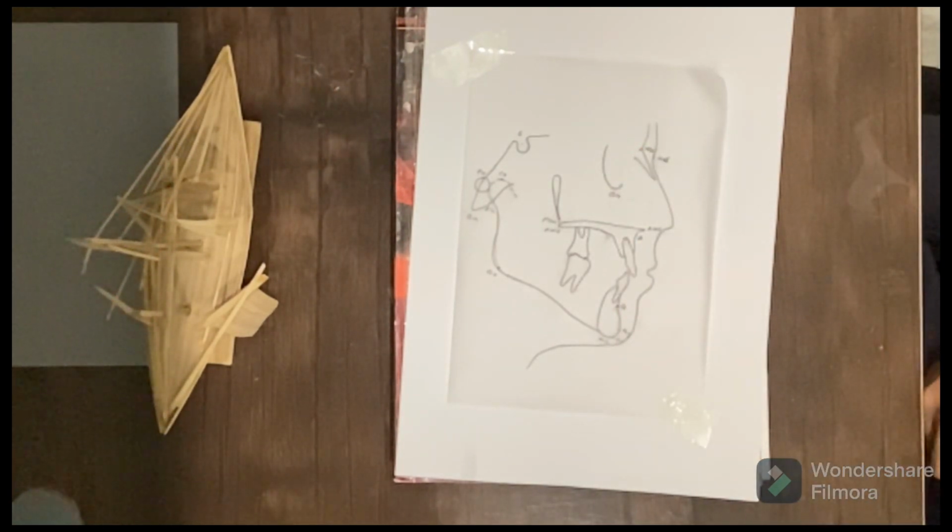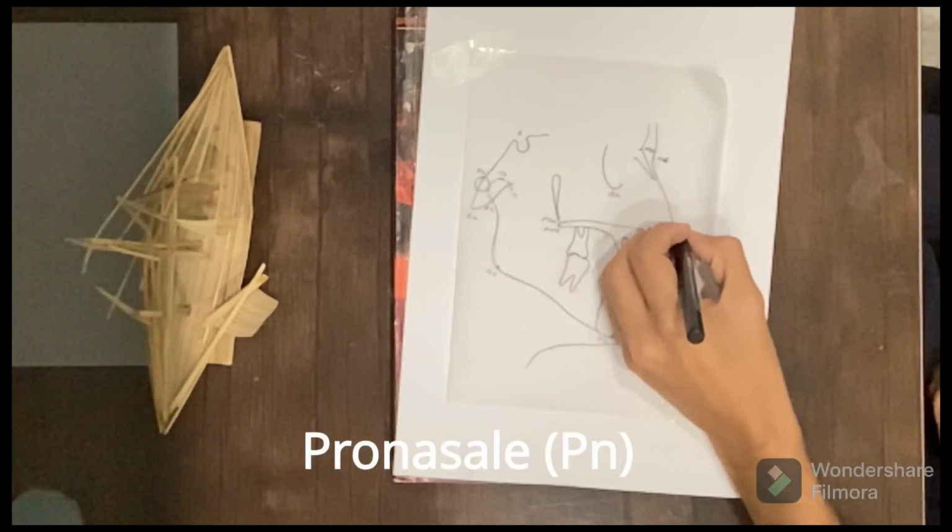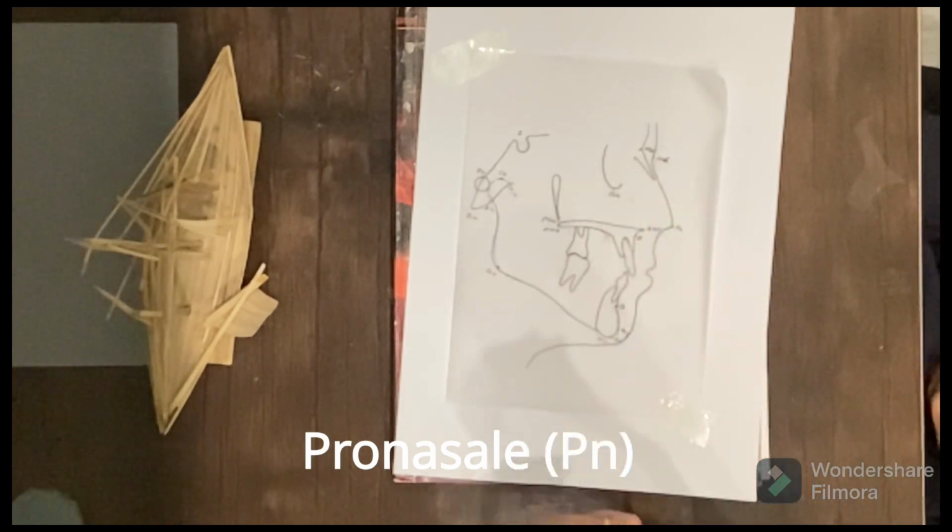And then there is pronasale. Pronasale is basically marked at the tip of the nose. So this is the tip of the nose and this is marked as pronasale, PN.